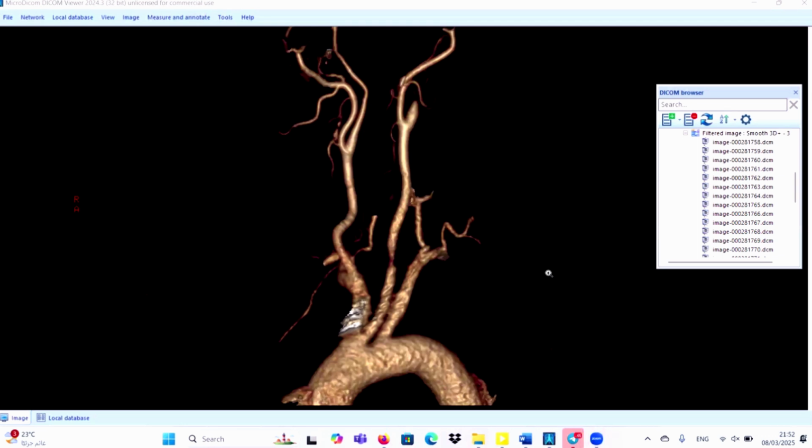You should trace the whole arteries. Once we start to trace the whole arteries, we will find a stenotic lesion along the proximal half of the left common carotid artery. We are not sure if it is real or not. We should check the thin slice image again.